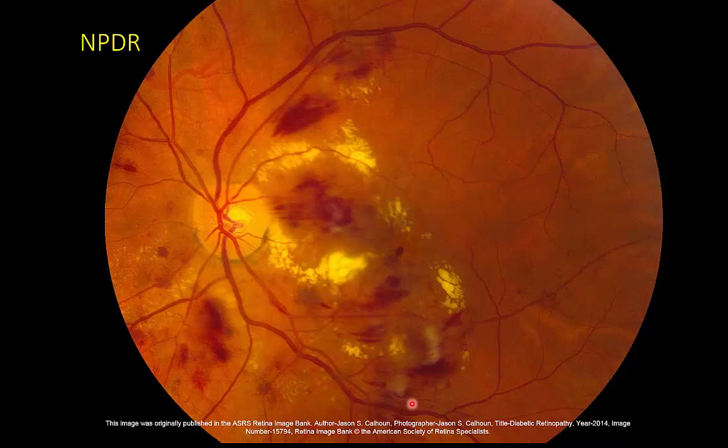Now here's a case of much more well-developed diabetic retinopathy. And you'll probably say to yourself, gee, this is pretty similar to that of the hypertensive retinopathy, and indeed, it's almost identical. So we see our flame-shaped hemorrhage here, flame-shaped hemorrhage here. Here's a dot and blot hemorrhage, a lot of cotton wool spots over here, over here, over here, which are a sign of retinal infarcts. And if you look very closely, you may see a few little dots, maybe over here, which is probably a microaneurysm. But again, a tremendous amount of overlap between diabetic retinopathy and hypertensive retinopathy. And of course, there are many, many patients who have both.